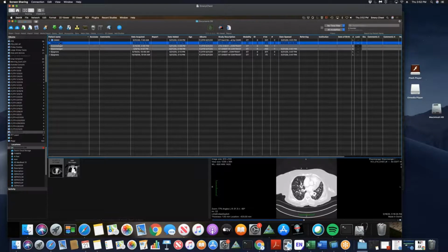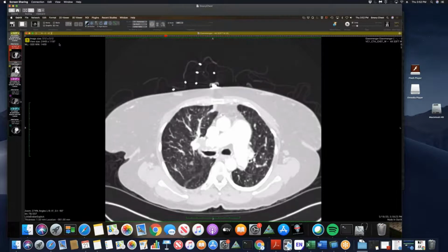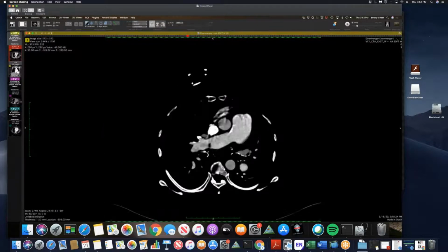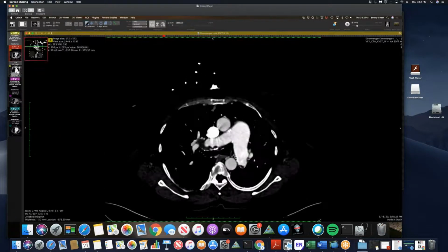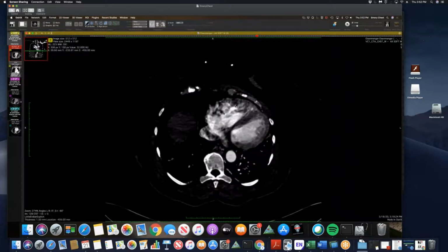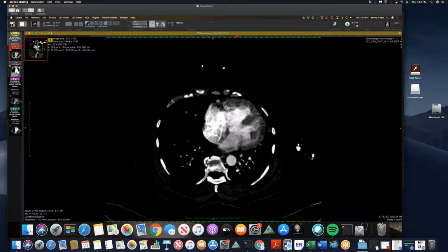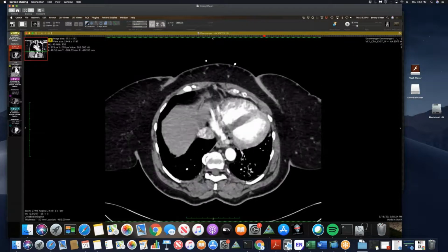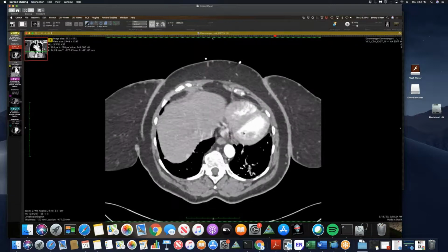And this is another case I recently ran into. This is a 70-year-old patient, and she has a history of, you can see here, a VSD, an unrepaired VSD. The thing that stands out here is this profound hypertrophy of her RV wall. It looks thicker than the LV. So she has Eisenmenger's syndrome, and she has a few other interesting associated findings.